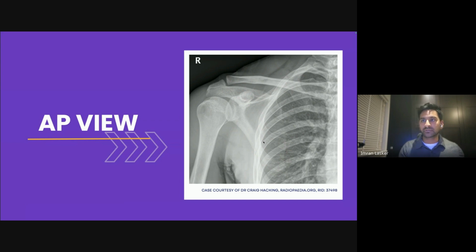And these are 3D people, right? So if someone gets a massive impact over on this side, then they're also likely to have an impact here. So there could be a scapular fracture, a rib fracture, there could be a popped lung, there could be all sorts of things that happen along with the initial fracture that you've seen. So always find the fracture, then move on to the next one.